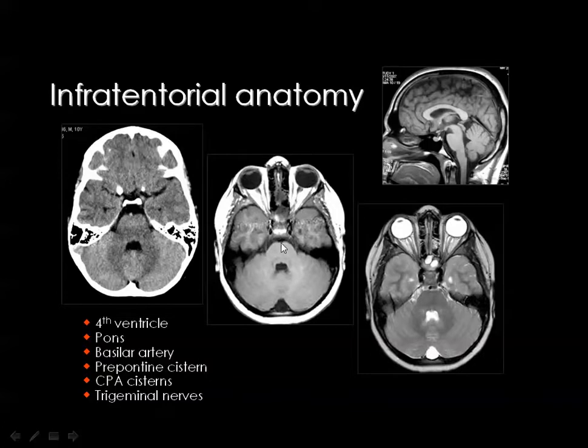Then the basilar artery will appear in MR images as a black dot in both T1 and T2 weighted images because of the well-known signal void phenomenon, as I hope you all know. Then look at the anatomic details I have written here.